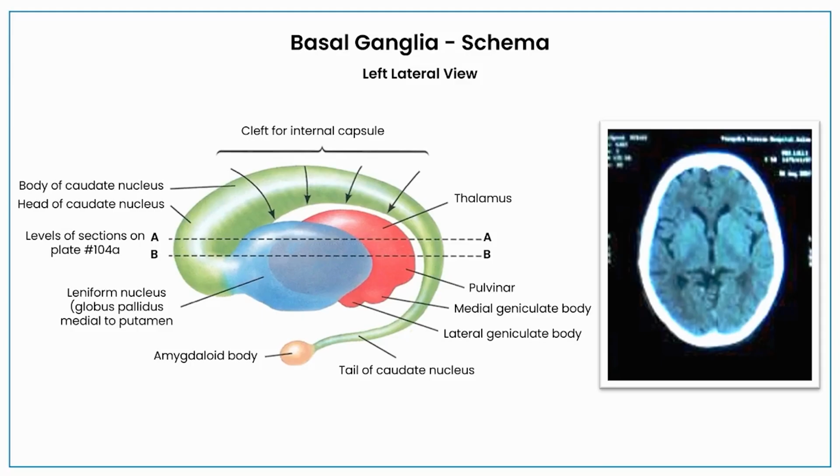It has got a head and a body. So the lentiform nucleus, the head, if you can see in this picture very clearly, when you slice the head, it kind of looks like a biconvex shaped structure. Look at the image here which I am trying to show. So what is this image? This is your third ventricle, this is your thalamus right next to it, and you have this wing shaped structure which is nothing but your internal capsule.